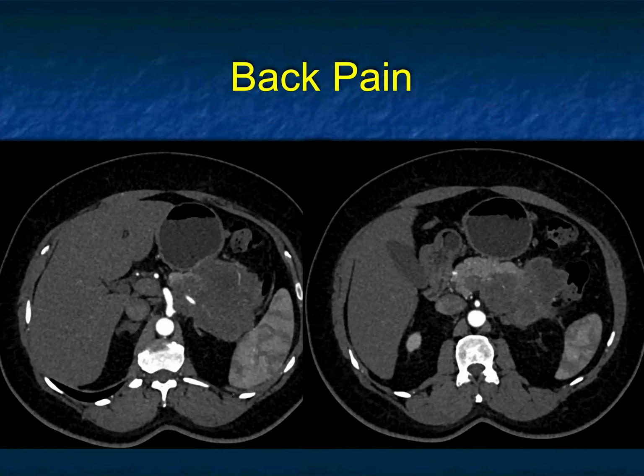Patient with back pain, large pancreatic mass, kind of funny looking. There's no dilated pancreatic duct. Could it be lymphoma? Yes. Could it be adenocarcinoma? Very bulky. Usually I like to see something else, but it could be. But what this ended up being, large mass, not very vascular or hypovascular, no dilated pancreatic duct, which is typical, a hallmark of adenocarcinoma. Lymphoma is a thought, but you better be thinking neuroendocrine tumor. And yes, I know neuroendocrine should be vascular, should often have calcification. Here it's soft tissue, there's no calcification, and there's no increased vascularity. An excellent example of a large neuroendocrine tumor.